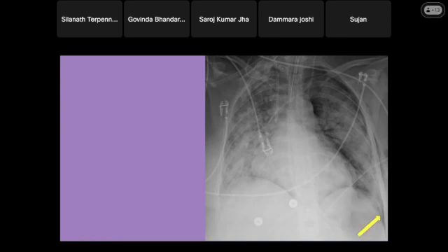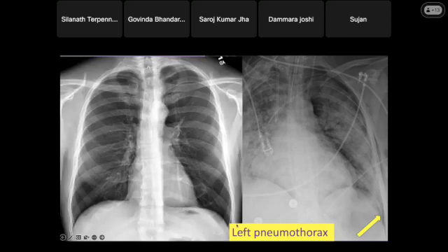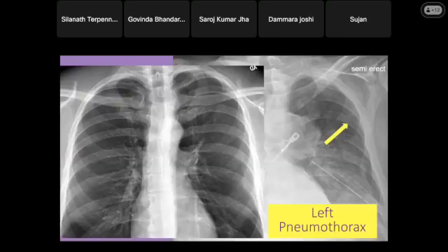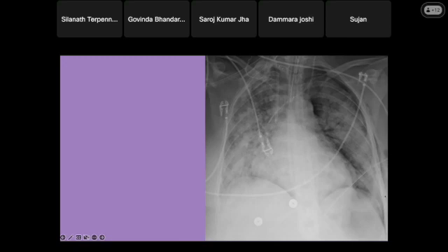I want to show you this. Okay, let's look at this one, this is pneumothorax. Look at this. Normally, it should not go that deep. This one is way deep down into the lateral sulcus, the lateral costophrenic sulcus here. So it's way deep here. When the patient is lying down and has pneumothorax, sometimes we don't see this. We don't see that because they're lying down, so everything is going up, but the air will go down into the lateral sulcus and sit there because of the position.